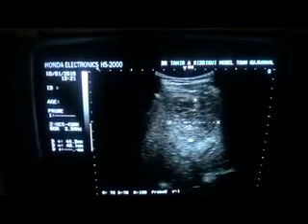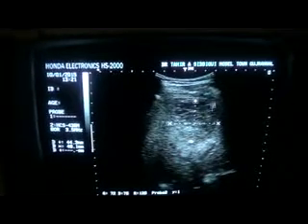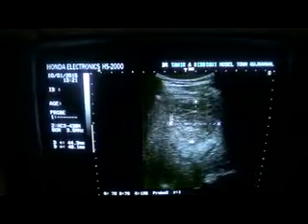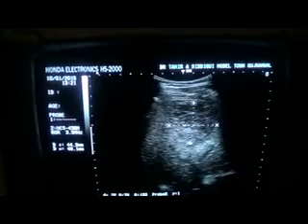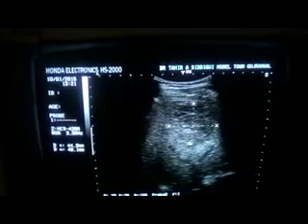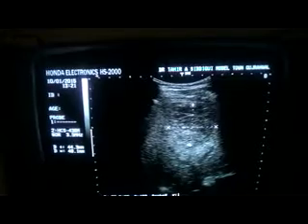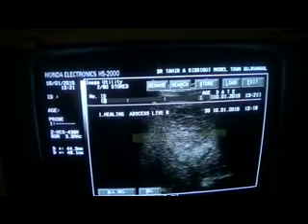It measures 4.9 by 4.4 centimeters, and by this view, this is a focal lesion of infective nature in healing phase, that is a healing phase abscess of the right lobe of the liver. Now why?